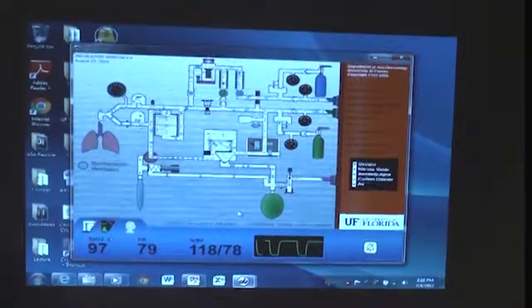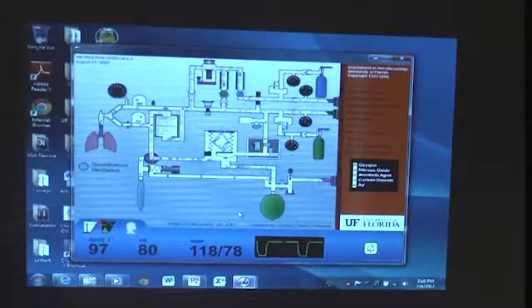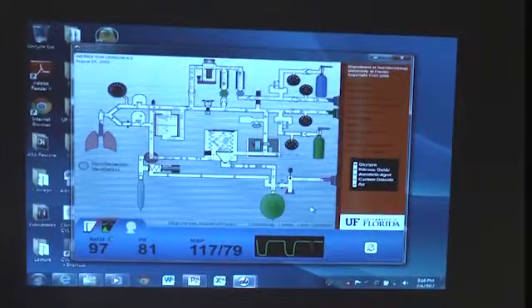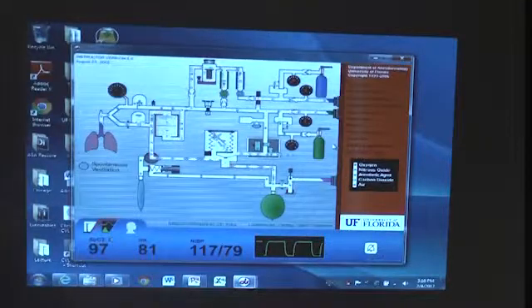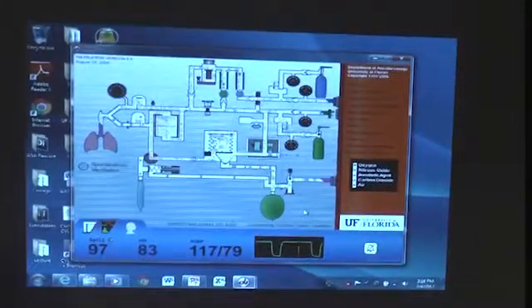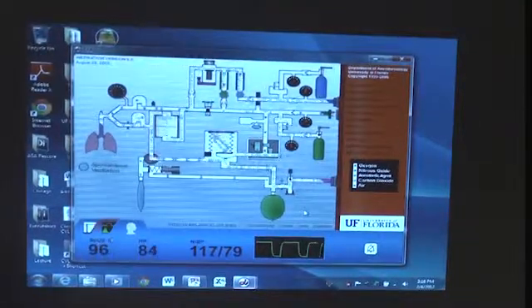And if you suspect that you opened your cylinder, you have to make sure you disconnect the pipeline, right? That's very important. And one more thing: if you had done a pre-use check, you were on some stations where you did the pre-use check, would a pre-use check have prevented this?